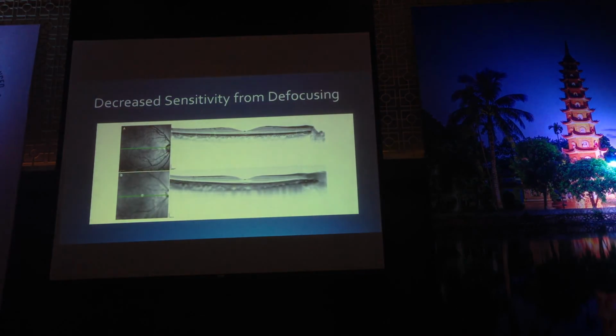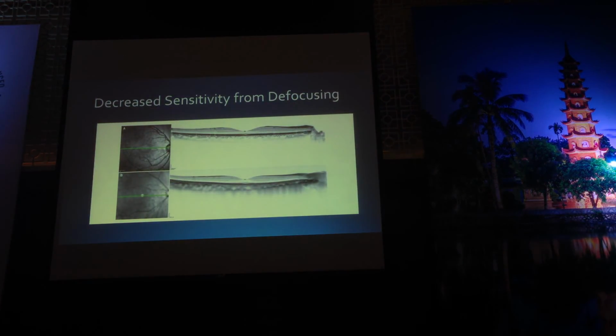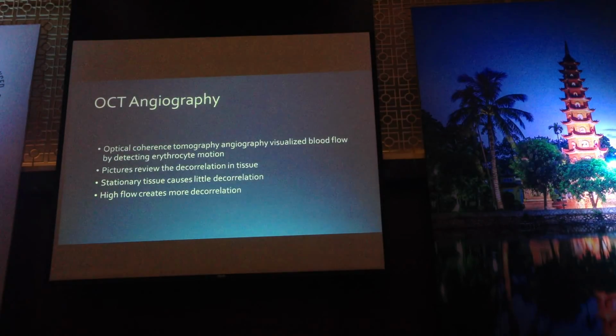You're not going to get a sharper image. The sensitivity is going to be lost from defocusing. I think that's about it for the basic interpretation of OCT.